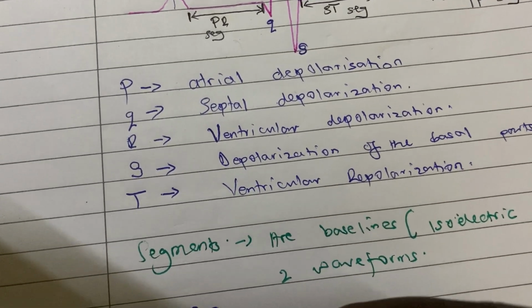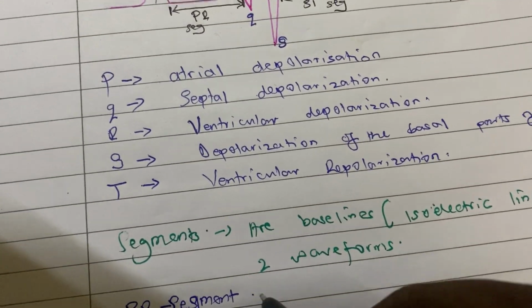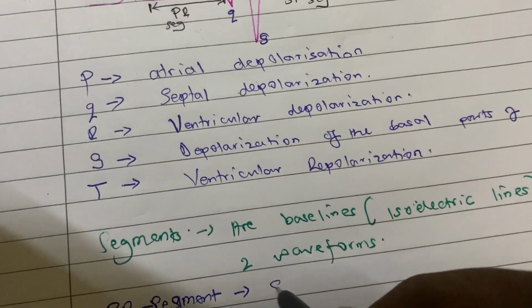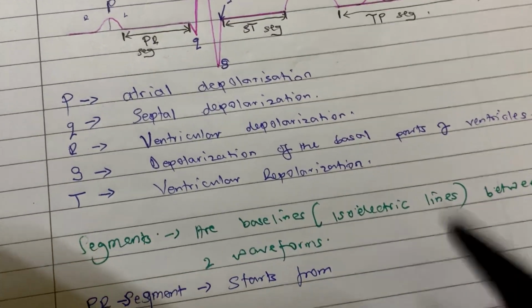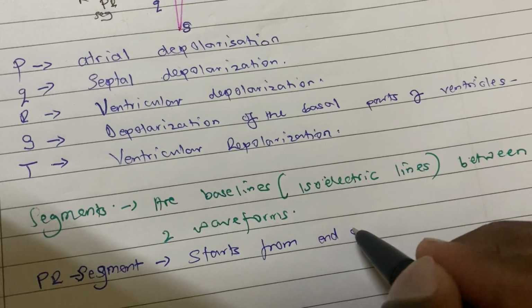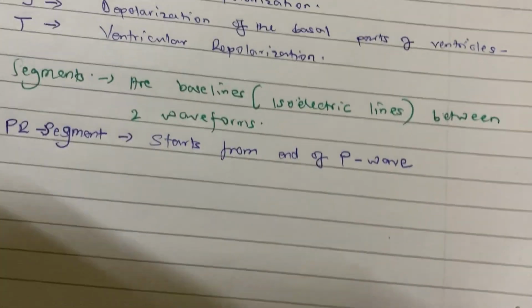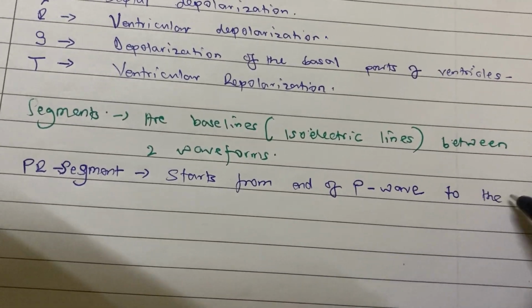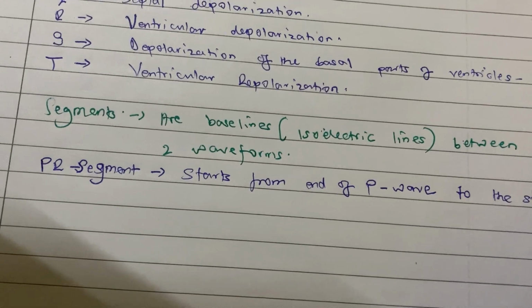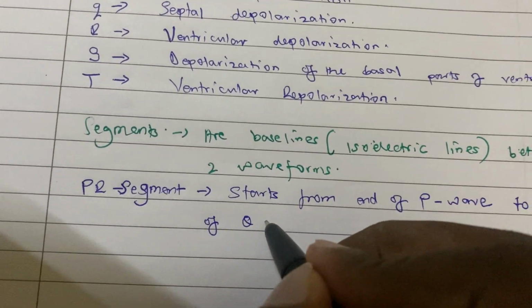Yes, segment, that is, starts from the end of P wave to the start of Q wave.